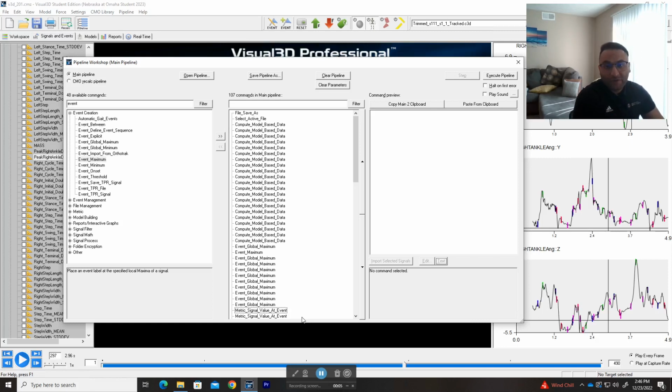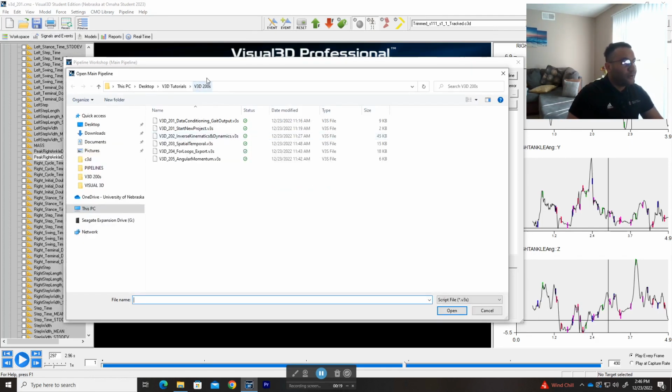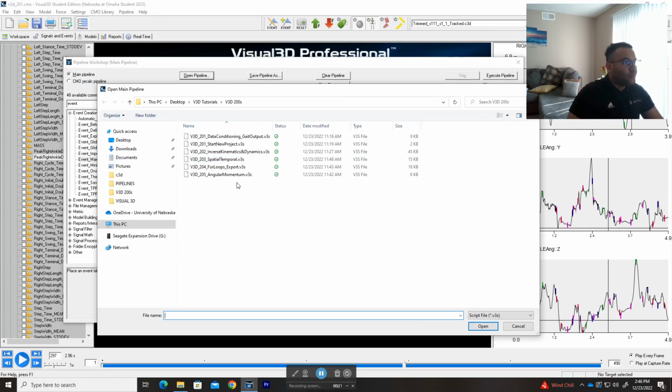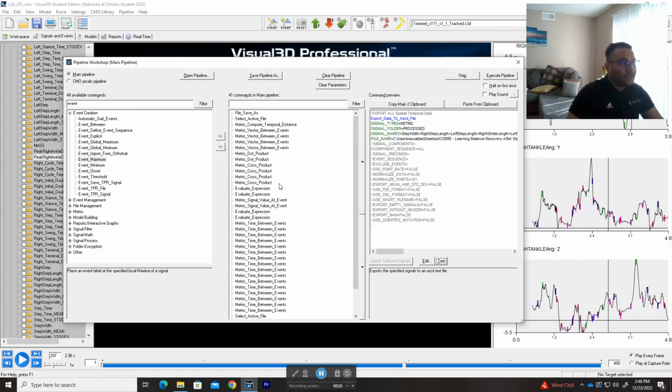Now we're gonna focus more on the spatial temporal aspect of the biomechanical analyses, and there are two ways of extracting spatial temporal. So let's first go ahead and open up our spatial temporal pipeline again. Like I mentioned, I always recommend that you first do it yourself. So follow here, follow the video, do it yourself. And if you have any troubles, then go back to the pipelines that I made.